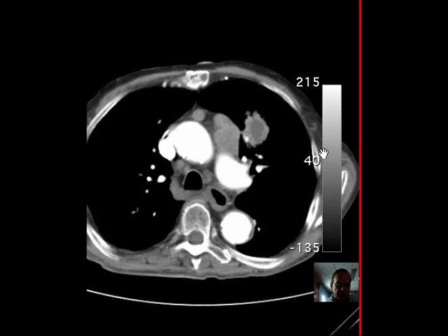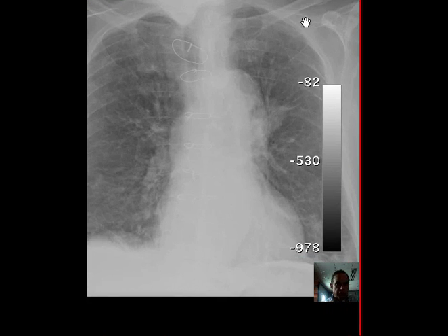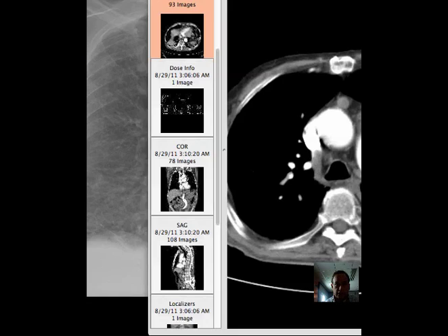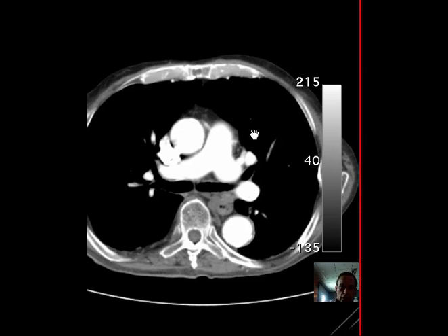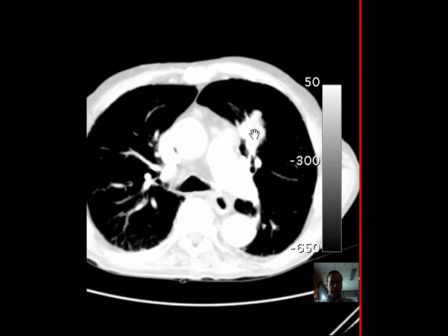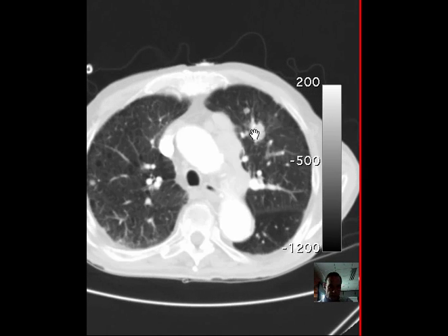Is it enveloping an artery? Well, partly this one. Is it extending into a bronchus or occluding a bronchus, that kind of thing? Whereas on the chest radiograph, you get a lot of information, but not nearly what you get on that CT. So you see that information, and it really does stand out quite a bit more here on the lung windows.